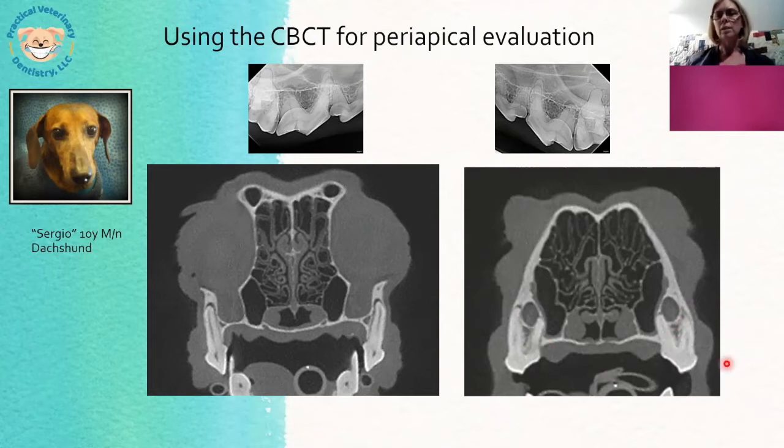So anything that is looking like a periapical lesion is really not. These are really actually quite normal periodontal ligaments. So I was very happy to be able to tell this owner that this is simply overlap of these roots on the normal structures that are there, but in a much more defined fashion that makes it appear to be a lesion when it actually isn't.